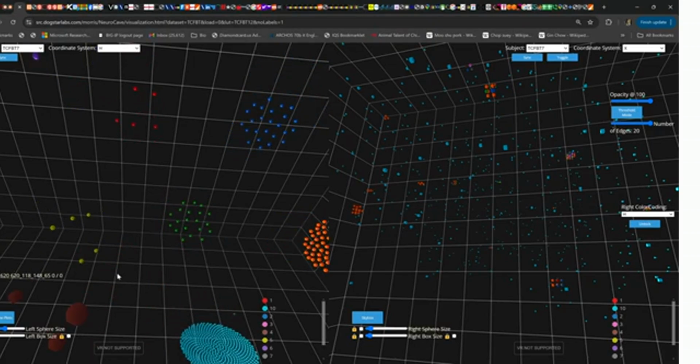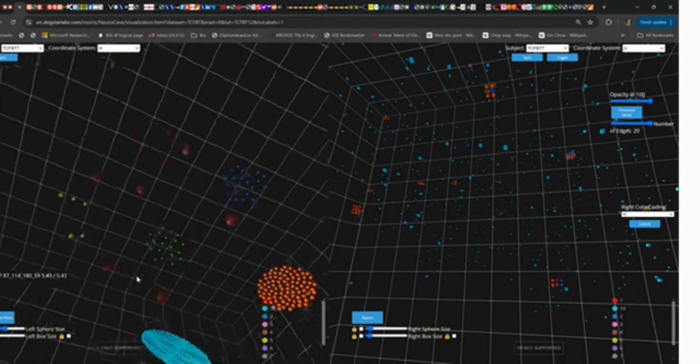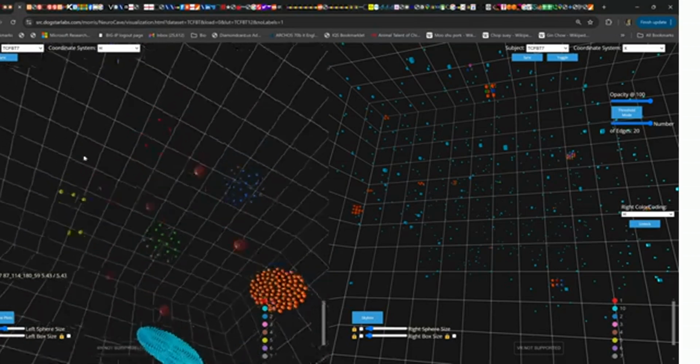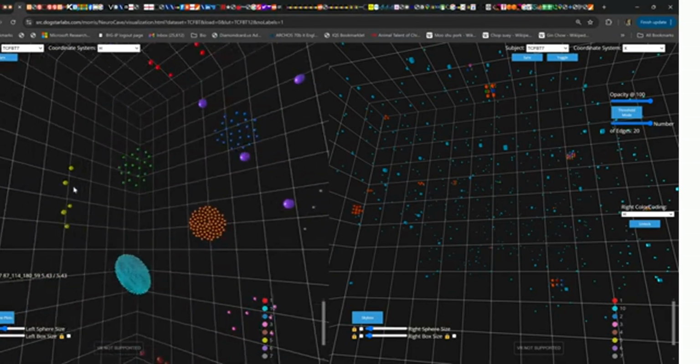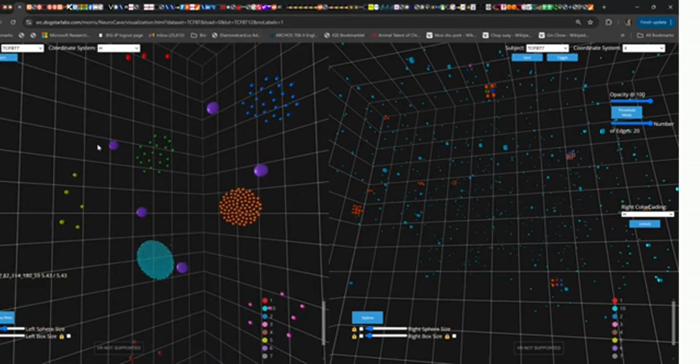So that really shows the cluster memberships. So you can use this to identify the clusters very clearly on one view.